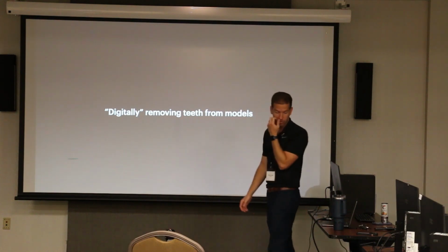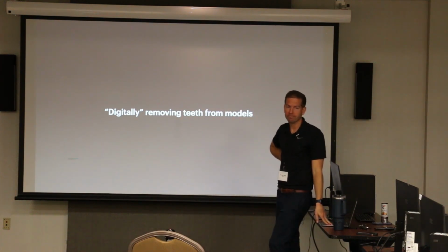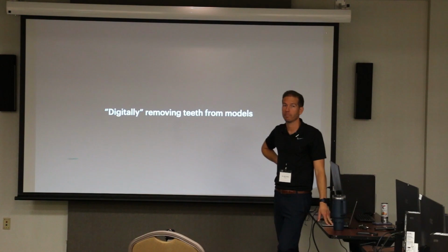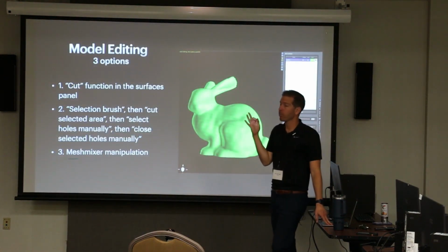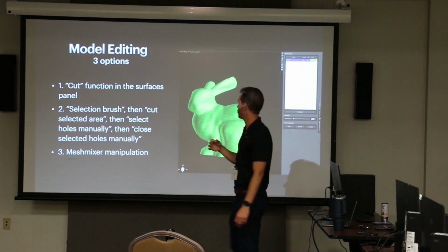We're going to jump into removing teeth, and then we'll finish this section a little bit more, and then maybe take a quick bathroom break, and then we'll jump into our first case on the computer. So let's talk about the 3 ways that we can edit a model.